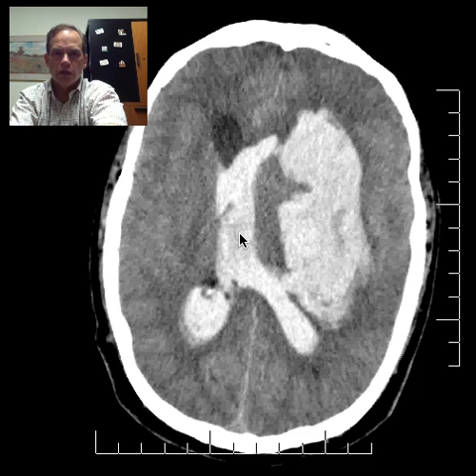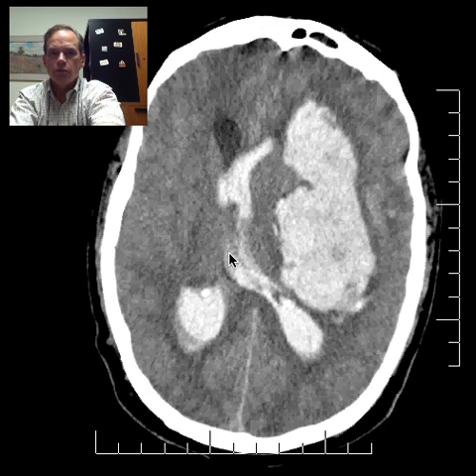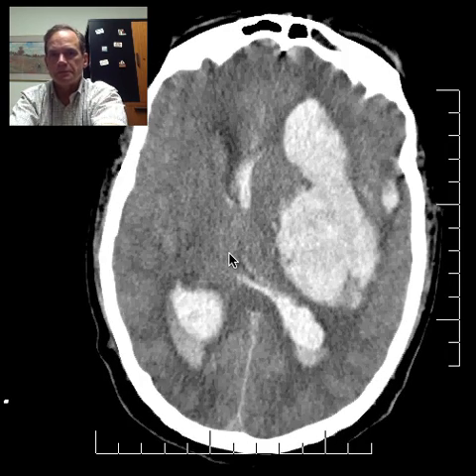There's a huge hemispheric hemorrhage on the left, and it is communicating with the ventricular system, and there's severe mass effect and midline shift. Some relatively short statement like that. And I would add that it's most likely hypertensive, because that's almost certainly what it is.